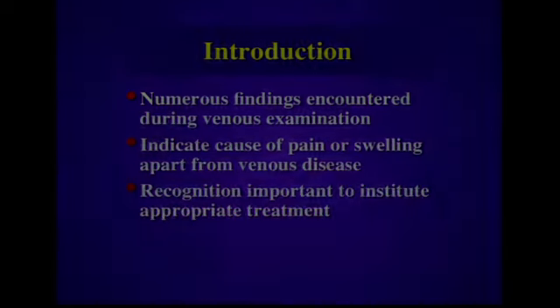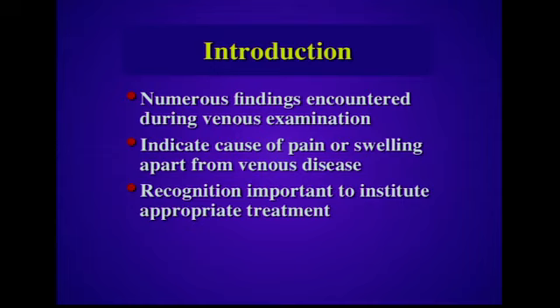What else can you see? I'm going to talk about some of the non-venous pathologies that you can encounter during your lower extremity venous examinations. In this presentation, we're going to discuss the numerous findings that can be encountered during the venous examination. These findings can indicate the cause of pain or swelling that exists apart from venous disease. And of course, recognition is important to institute appropriate treatment.